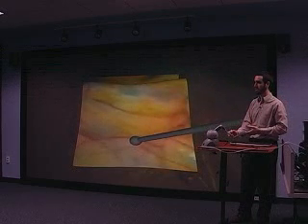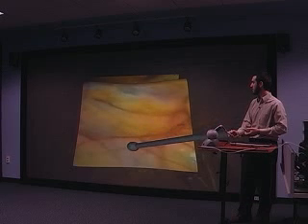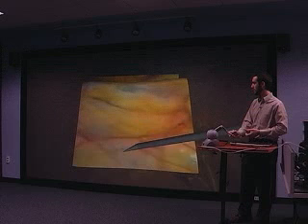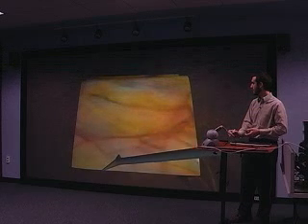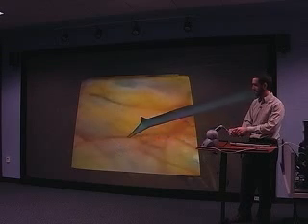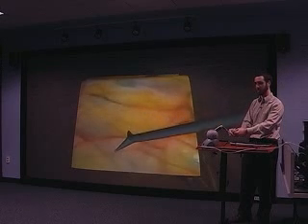There's several different tools that the surgeon uses. So we've modeled here, it's supposed to be like a cautery tool. And then another tool that you have here is a grabbing tool. By pressing down on the button here, it's similar to squeezing some tongs.